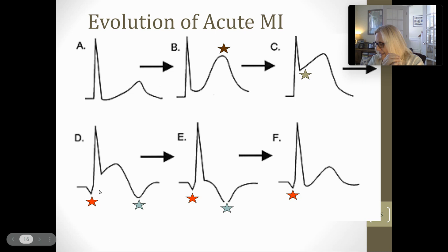That is spelled, you can see it on number 14 just below on your paper. It says pathological Q, okay? So the pathological Q happens after you've had a heart attack in whatever region you had a heart attack. So this Q wave gets deeper and wider. It's subtle. You may or may not notice it on an EKG right away. Okay. I don't always notice it.